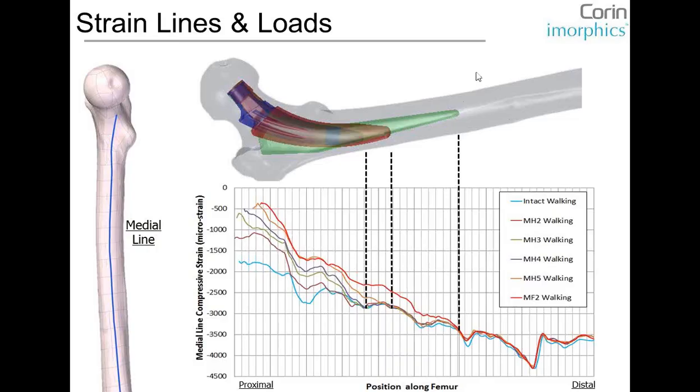So this is the great thing about COMSOL, that you can do all this inside COMSOL, and you can do it in real time. For example, if you're interested in doing patient work and you need an operation tomorrow, you can actually do this study overnight and assess which position to lay the implant is best.